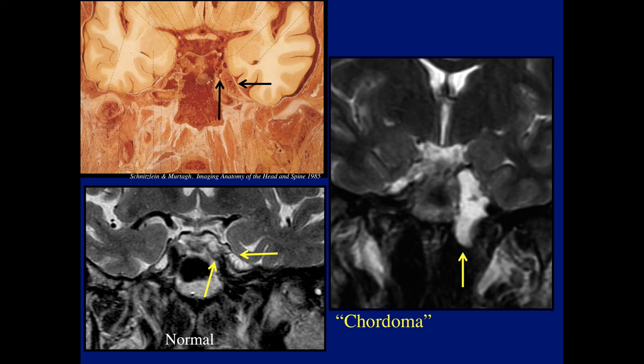The patient, as I said, was followed for many years, and we felt that this is the most likely diagnosis. Again, notice in this coronal image, here's the lesion, and here's the cavernous sinus, the sixth nerve, and the Dorello's canal, and the third above. Meckel's cave, the sixth nerve, and the third above. You can see how, in this case, the region of the Dorello's canal would be involved. Why this patient presented, and always had a sixth nerve, no other symptoms.